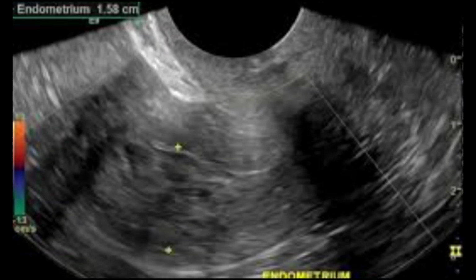On this transvaginal scan, the image is slightly fishy because the posterior wall and the penetration of the endometrium within the myometrium show that some pathological process is going on. So as my first differential I would go for endometrial carcinoma, and in the second I will include metastatic deposits from either the ovary or fallopian tube, and I will look for the history.